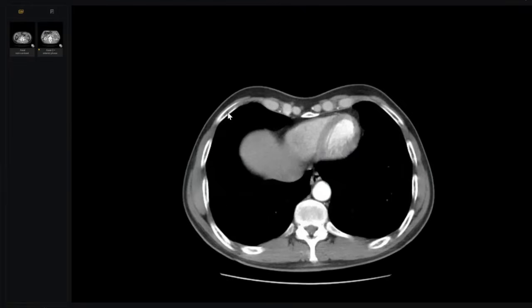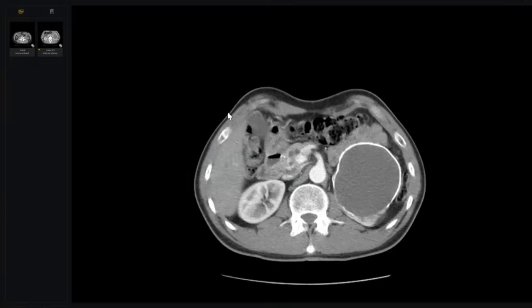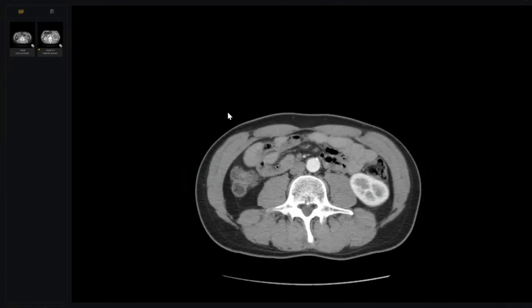Rest of the visualized abdomen appears normal. There is no pleural effusion seen. The liver and the spleen appear unremarkable. And the patient has presented with abdominal pain and confusion. No MPR images. Sir, I would like to know if there are any ultrasound images available, or I would proceed with the MRI for further characterization of the lesion.